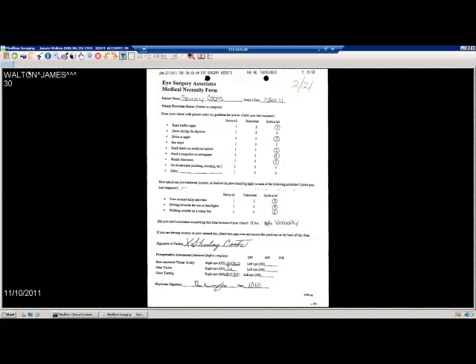The T will hide the patient's name. For example, if you've done a visual field and the patient's name is covering up some of the wording, you can select the T button to hide the patient's name. This will allow you to see a grid view. If you have multiple images, it will allow you to see all of the images. This will only allow you to see the single image.